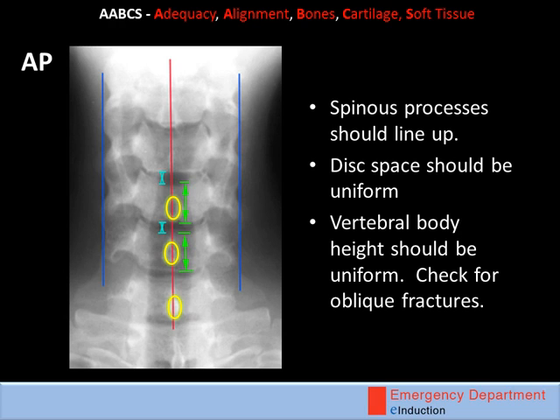It's also prudent to check for a pneumothorax. It's always embarrassing to miss this in your trauma patient.